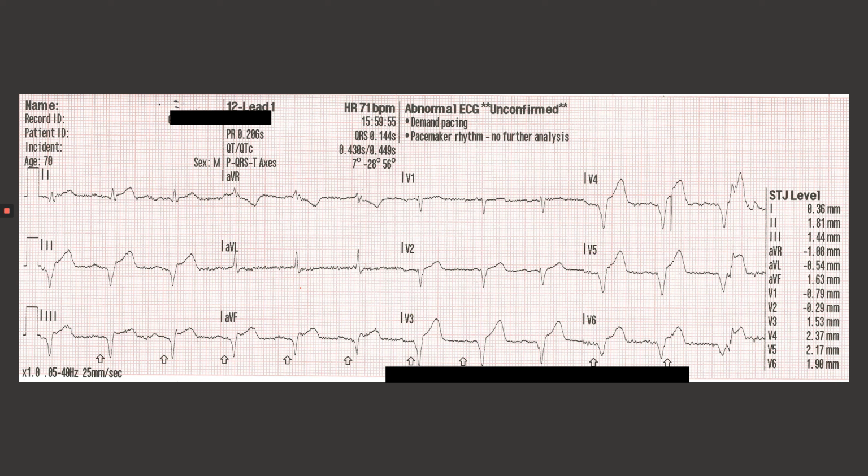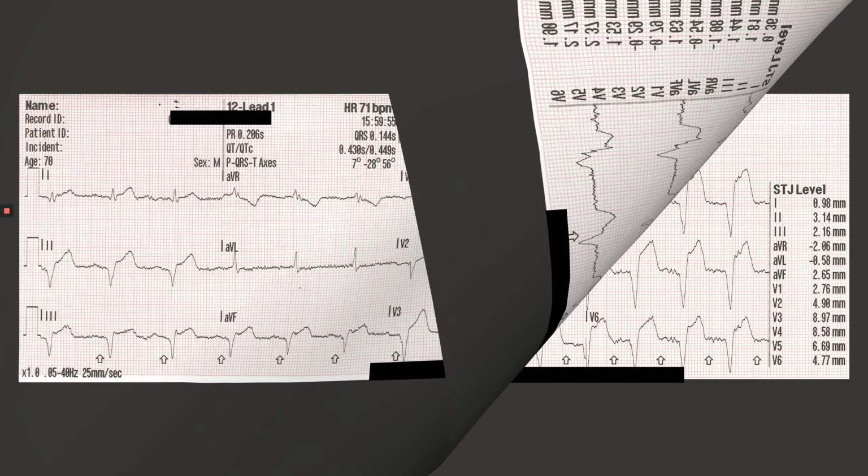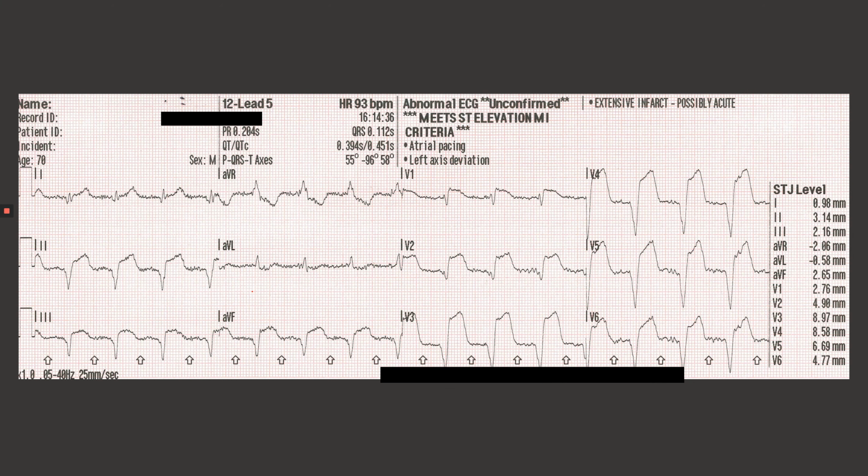But now, let's take a look at this one. Important thing, because this brings a point I want to make sure everybody knows and does. This is the same patient, just later. This brings in the importance of serial 12 leads and the differences that can occur. It looks a lot different than the previous one. Again, we're looking at our criteria here. We do have this concordance that remains. Everything else is discordant here.